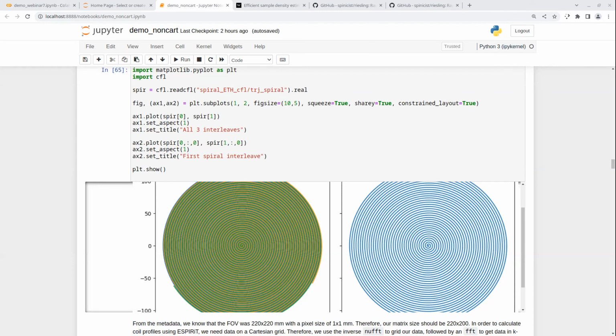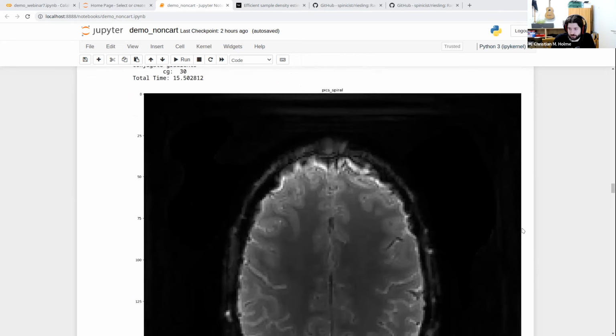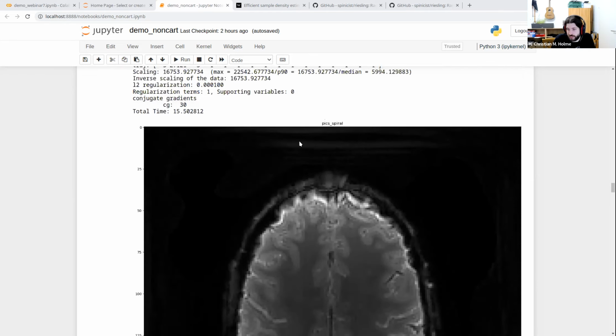I think you mentioned that on the sensitivity map, outside the brain is not 0. If we mask the background to 0 on the sensitivity map, will that be helpful? Probably. It's not really a problem here, so I didn't do it, but you certainly could. The only thing where you see any issue is that there's a tiny bit of white up here, which would go away if you mask it. It's not going to break anything. It's not going to help overly much, but it might be a good idea in cases like this.